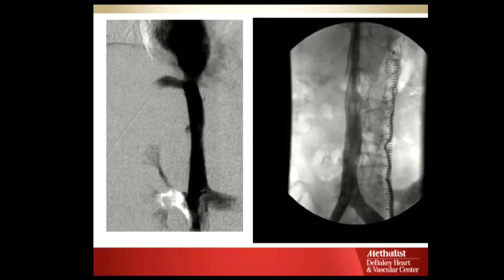Renal's coming in. This is washout from the renal veins, okay? See how nicely opacified it is here? You got this non-opacified blood coming out of both renal veins, washing out. And so this is just a flow artifact. The cava is normal. That's the sort of thing that you will see.